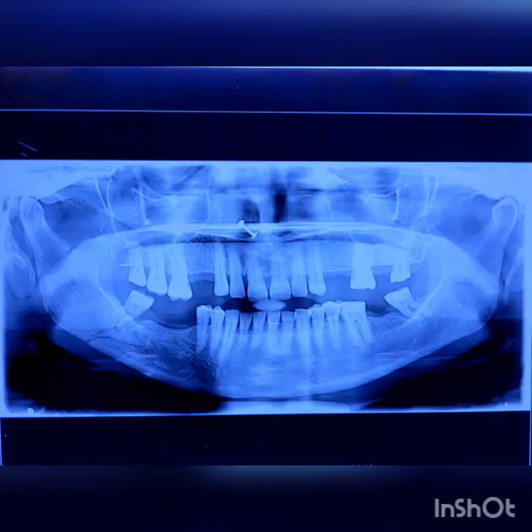Radiographically, it is compound minimally displaced fracture at 4-8 or at the junction of right side body and angle with simple minimally displaced fracture of mandible at junction of condyle with ramus.